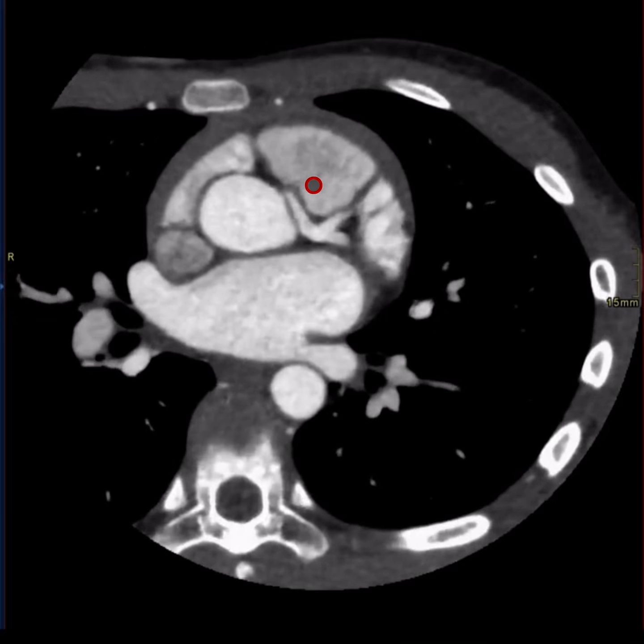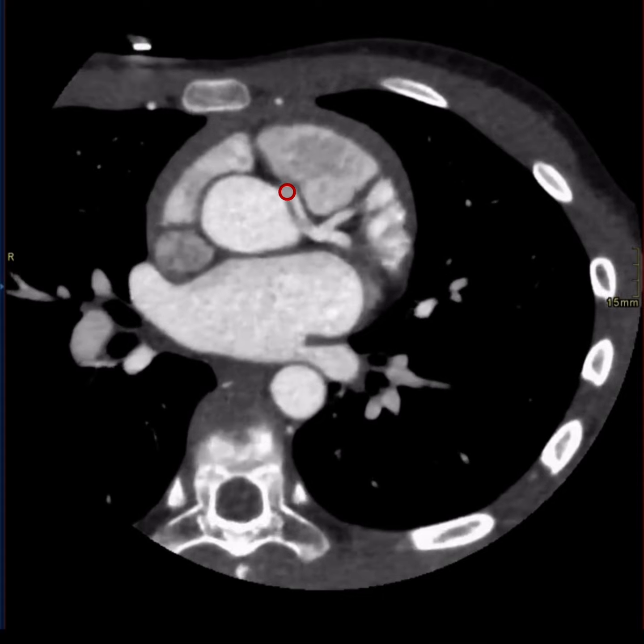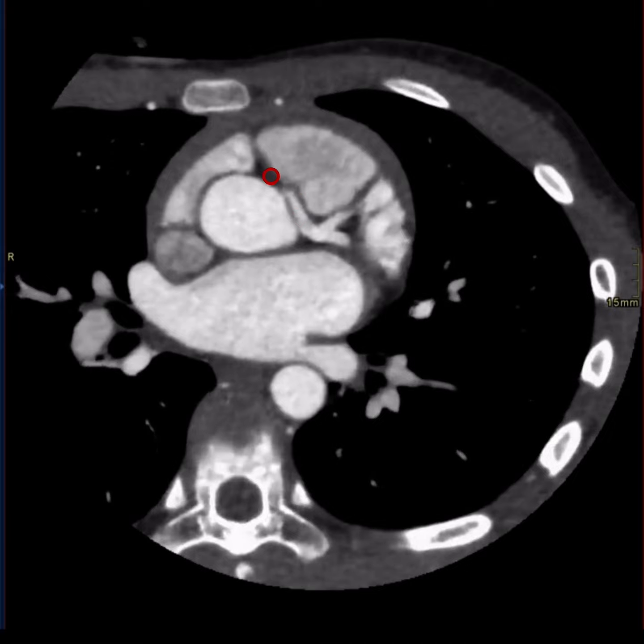And these are 2 high-pressure systems, so this causes compression on the main stem. And you can actually see that quite well here when you compare the diameter of the main stem in this interarterial segment and compare it to more distal segments, right here, the distal LAD, the bifurcation, and the left anterior descending, and the circumflex coronary artery. They are wider, so this is a form of post-stenotic dilatation.